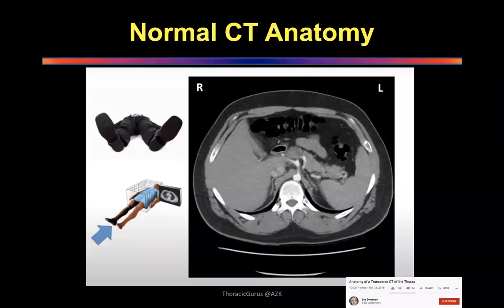Okay, is this clear? Did you get the orientation of this? How are we looking at the CT and how are we looking at the patient? Clear? Yes, sir. Okay. Good. Now let's move to normal anatomy.